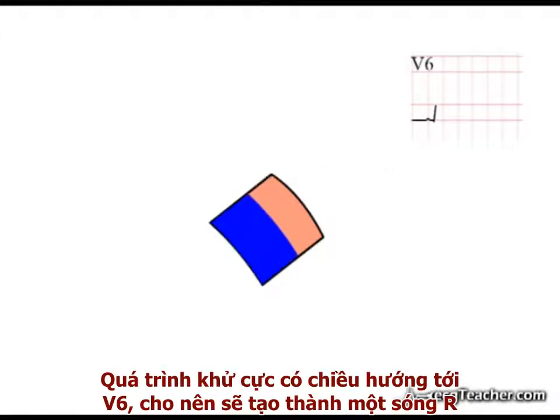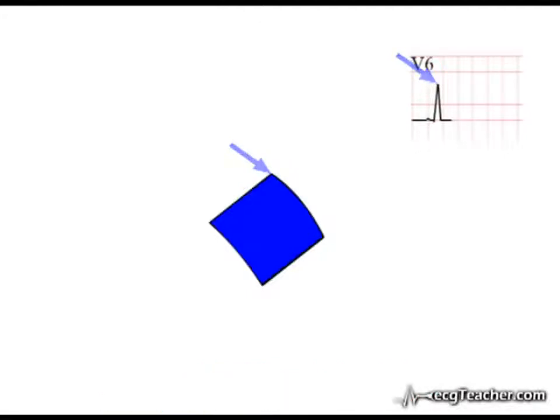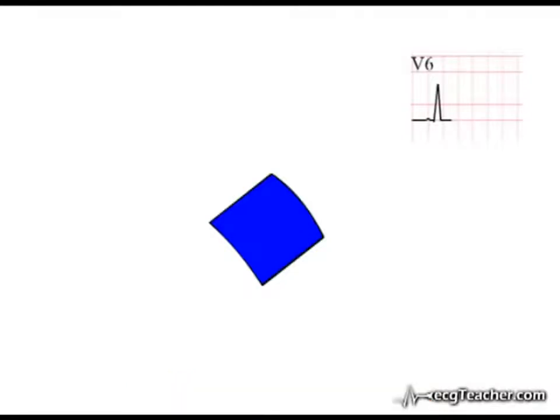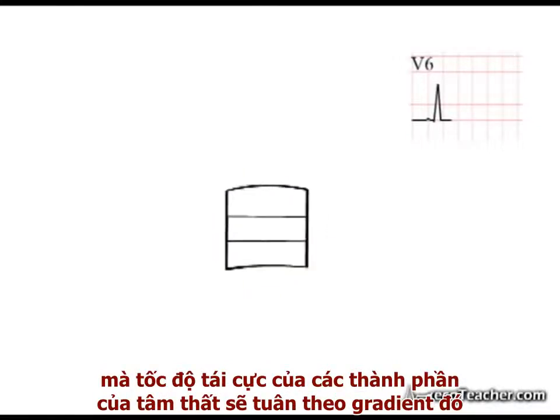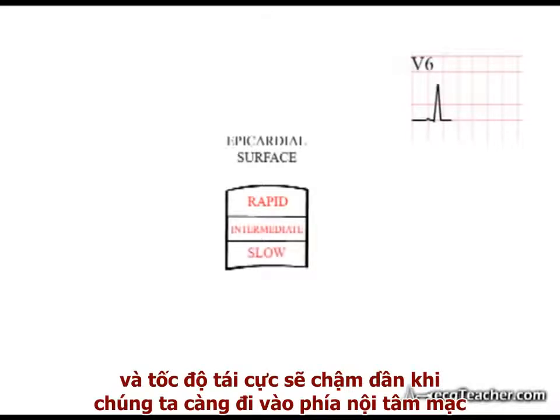Depolarization moving towards V6 produces an R wave, and the peak of the R wave represents the moment when the depolarizing wave has reached the epicardial surface of the ventricle. You will remember that unlike depolarization, ventricular repolarization is not propagated between cardiac myocytes. Cardiac myocytes repolarize at their own intrinsic rate. However, there is a gradient across the ventricular wall in the intrinsic rate at which cardiac myocytes repolarize, with cells at the epicardial surface repolarizing rapidly, while cells repolarize more slowly as we move towards the endocardium.